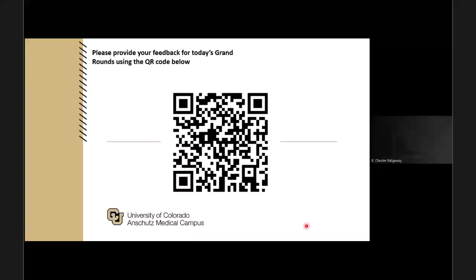So the thought behind this AI-generated image is remove the bones and you remove that caveat. I personally do not like relying on those because it's not a perfect technology, and sometimes it subtracts out opacities that it should not be subtracting out. So sometimes it can be helpful, but I personally do not use it, and I don't know of many chest radiologists who do. So feel free to ignore it.